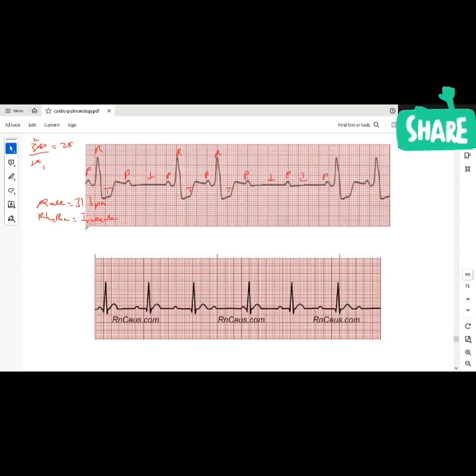Is this a sinus reading? No, not sinus. Are we on the same page? Yeah. So far, so good? Yeah. Okay.